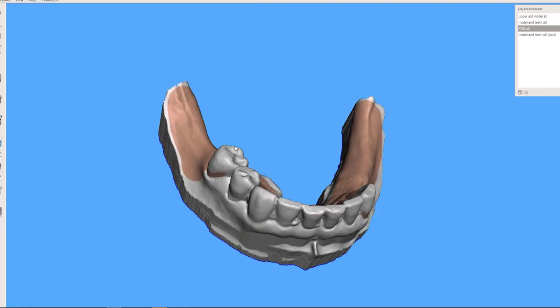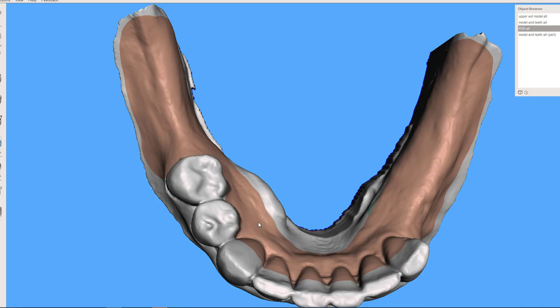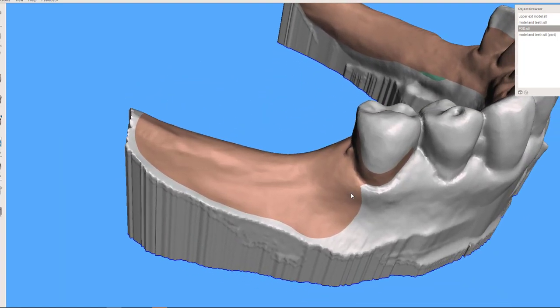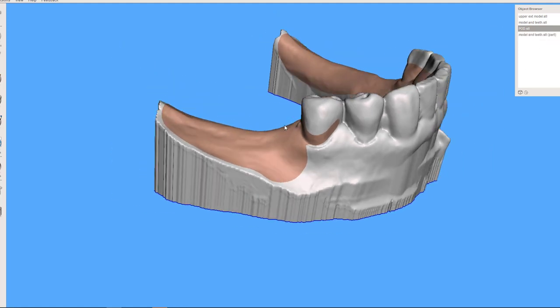So I would at least want to create a little bit of an offset spacer and not go dead zero to the teeth, because it's going to end up fitting a little tight. In my experience, like a surgical guide, we usually do a 0.2 offset between the surface of the tissue or teeth and the guide. Let's go middle ground here. We want a little more intimate fit with this and for it to snap in.